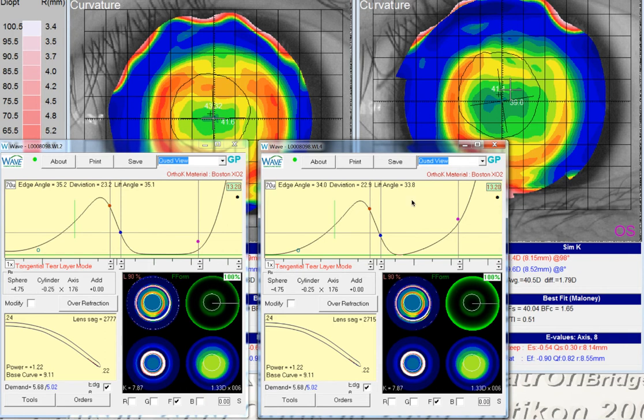So what I'm surmising is that usually when we see this, it's because we're not getting a very good seal of the lens. This transition would imply that although WAVE predicts that the lens is touching here, we're probably actually touching out here a little bit, and lifting that up has caused us to lose some of the fluid force there.